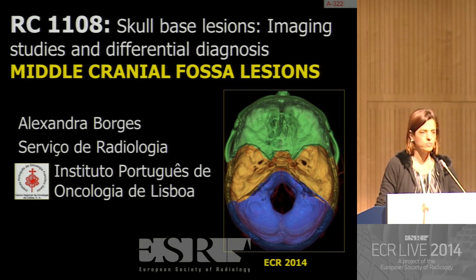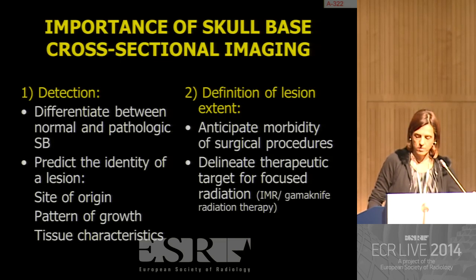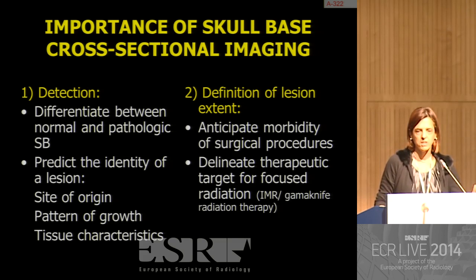So we'll move on a little bit more posteriorly in the skull base, and I will talk about the middle cranial fossa. So the problem with the skull base is that it's a hidden area for clinical examination. So patients that have lesions in the central skull base, the clinical symptoms and signs are either very scarce or non-specific.